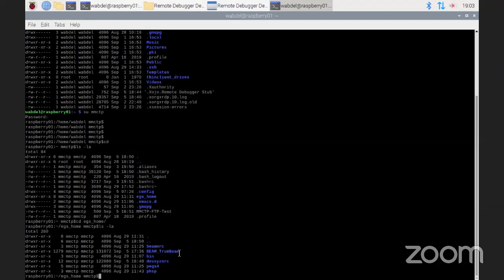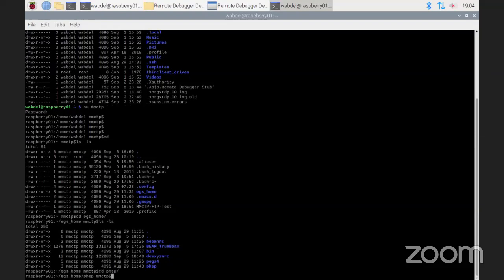So the BEAM is there, and we have gone through making the BEAM and making an input file, those XYZ, to use BEAM as a library or to use a source as a phase-space file. We have gone through all of that. So I just wanted to show you there is nothing really special on my BEAM, on my EGS side. The only thing I have, maybe different than all of you, is this directory. I call it phase-space.